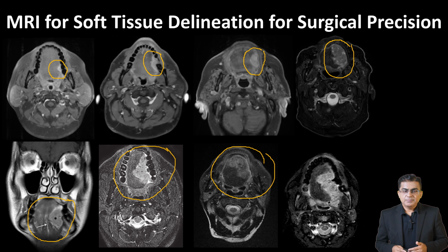Patient 8, bottom right. He has a massive, highly destructive tumor replacing almost the entire front 2/3 of the tongue. It extensively crosses the midline and goes far back toward the base of tongue. Both neurovascular bundles are likely compromised.